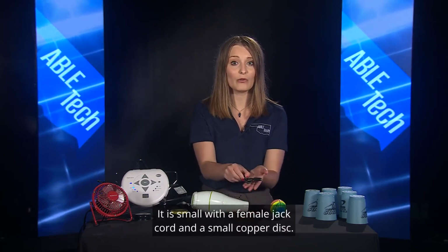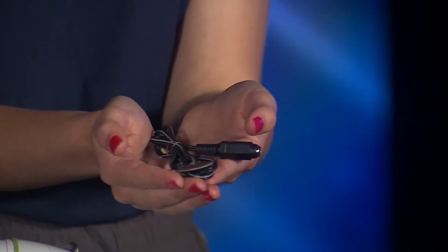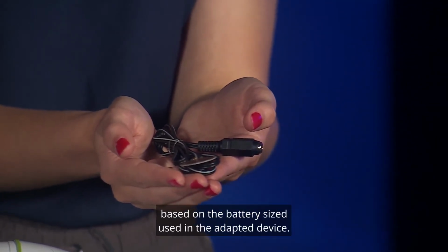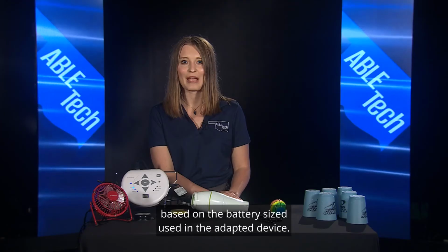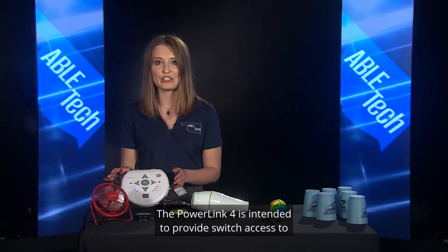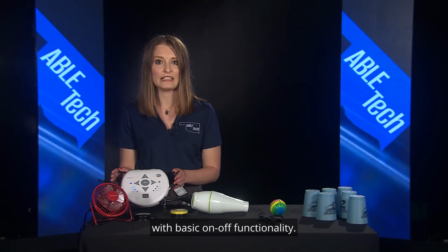It is small with a female jack cord and a small copper disc. The size of the battery interrupter will vary based on the battery size used in the adapted device. The PowerLink 4 is intended to provide switch access to and control of electrical appliances with basic on-off functionality.